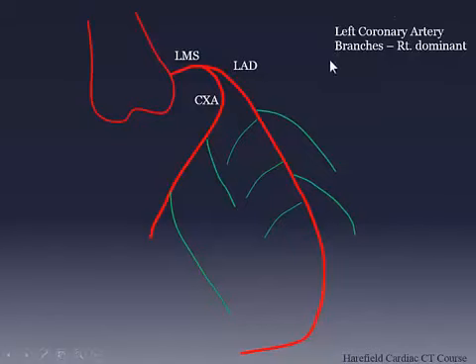So, right, look at the C, proximal, mid, distal. Circumflex, proximal, distal. I sometimes use this concept of the mid portion because I'm just trying to convey where it is, because obviously if you say distal, most people think it's quite far away. And similarly on the LAD, sometimes you can get caught out because when you look at these scans, the diagonal's really, really far away and then you're thinking, well, if I'm going to divide it up based on that, it can be a bit confusing. Do I call a tiny weedy branch D1? So you'll develop the language. So principal diagonal is quite helpful if you're not trying to say it's D1 and you're not sure if it is D1. And similarly, you can divide it up arbitrarily, but that's the SCCT convention.